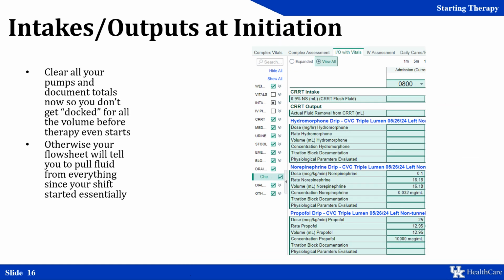When we start CRRT, we probably have many hours worth of intake that we have not charted, and we want to make sure we do that before we actually start CRRT, otherwise we'll be docked or penalized for all this fluid. So let's go ahead and chart all of those I's and O's at 8 a.m. before we start CRRT.